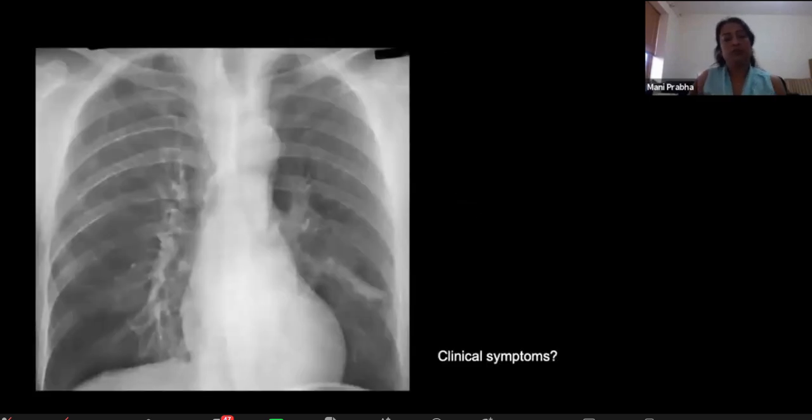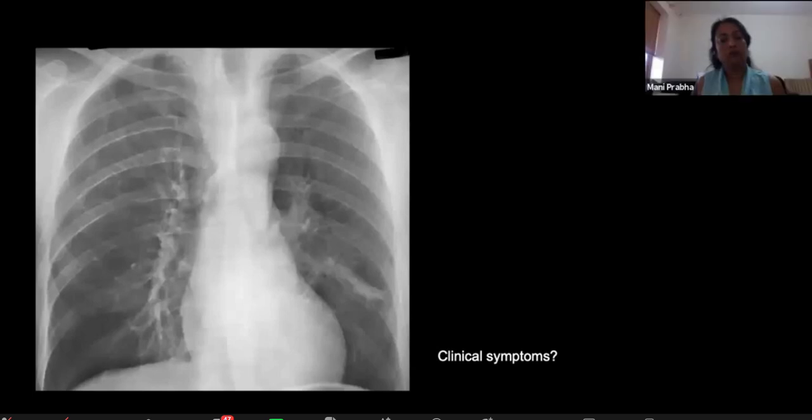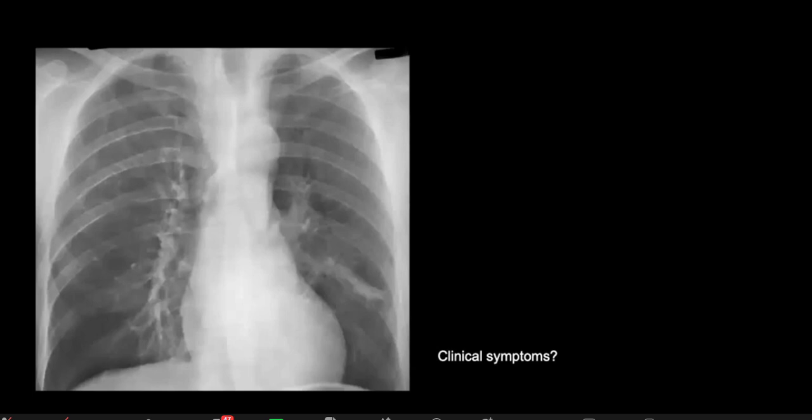Next one. So frontal radiograph, this seems like a slightly older child. In terms of situs, levocardia, the aorta is left-sided. The contour of the left mediastinum is also abnormal. It has a sort of a three-shaped configuration.